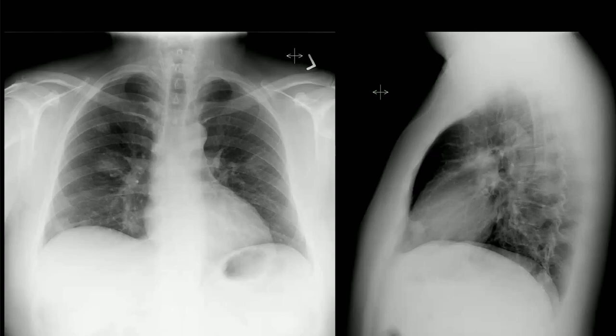Correlating these on the lateral chest radiograph, these are most likely nodules; I cannot comment on their margins. There is no cavitation or calcification in these nodules. The hila appear unremarkable and the CP angles are clear. The visualized bones are also unremarkable.